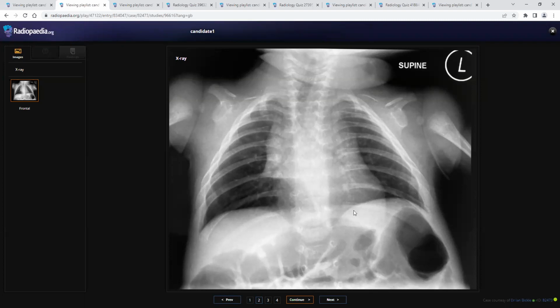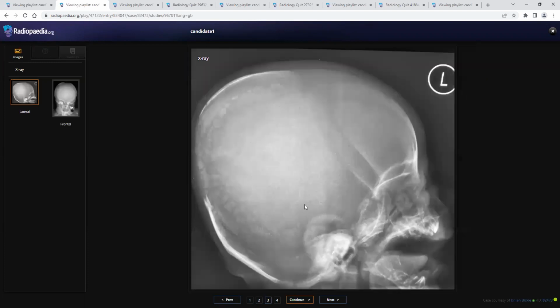Can you see the clavicle here? Oh, sorry. Cleidocranial dysplasia. Yeah, this is absence of clavicles. Both clavicles are absent, you are right. I didn't go systematically in this case. Okay, and the baby has been imaged with a skull also. Can you describe this skull? Yeah.